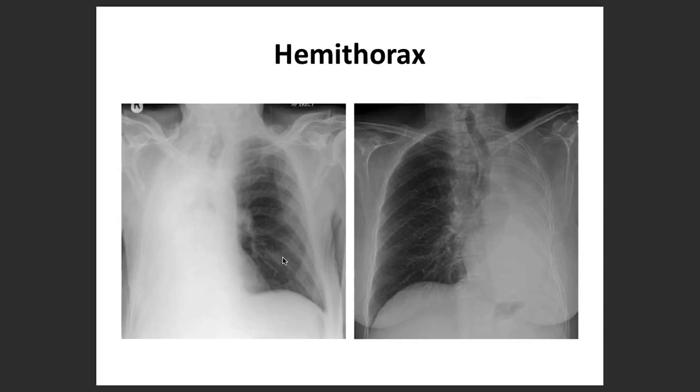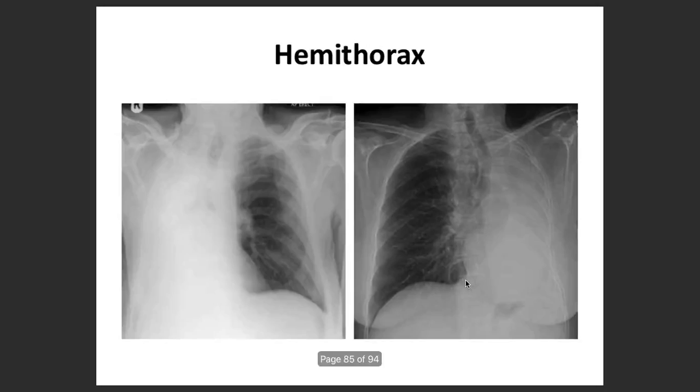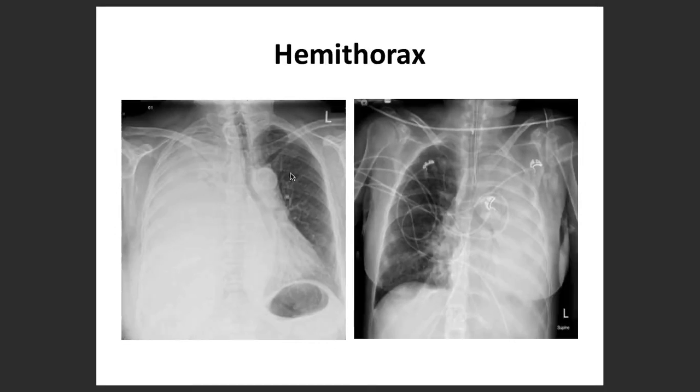For example, in this, if you notice, and this as well, towards the opacification. Otherwise, the third thing is that it will remain in the middle. So these are different types of opacification. This one is remaining in the middle, this is getting pulled towards the opacification, and in this it is away, right? So these are the three types.